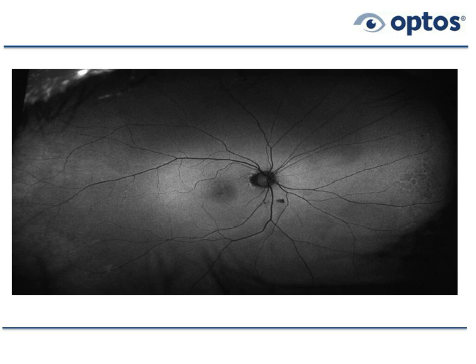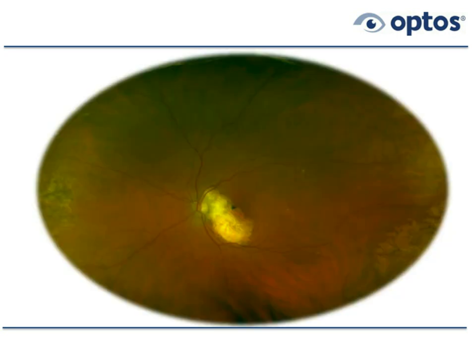Patient came in at age 89 complaining about blurred vision in the left eye. And the patient actually had a fluorescein done. This goes back a bunch of years. It's an interesting case. The patient is older now, of course, about 10 years older, and is still alive. What the fluorescein showed was a definite leakage in the macula, between the disc and the macula, and the patient had a choroidal neovascularization membrane growing.